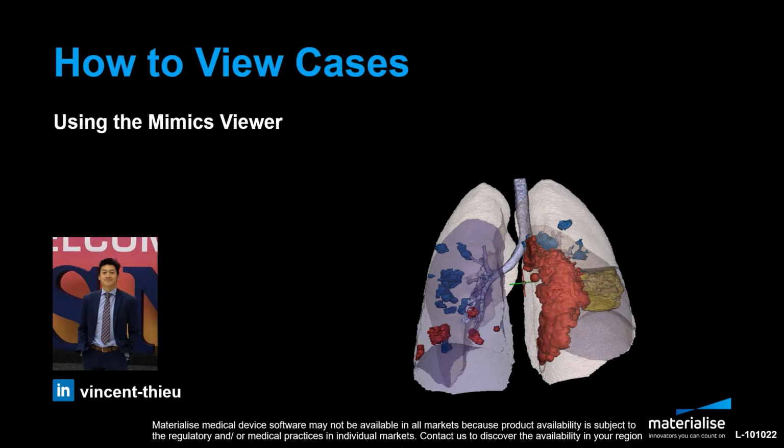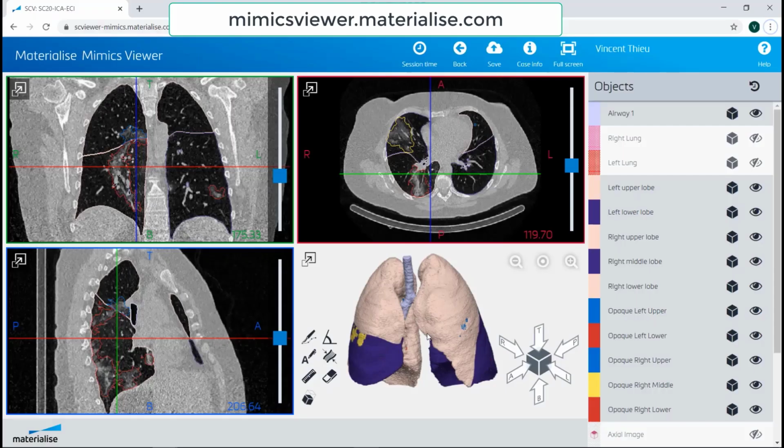So in this video, I will show you how you can use Mimics Viewer to visualize and measure CT scan images of a patient with COVID-19, as well as the 3D model of COVID-19 inside the patient's lungs. Here is the Mimics Viewer. After segmenting and creating the 3D model in Mimics, you can import the Mimics files into the Mimics Viewer.